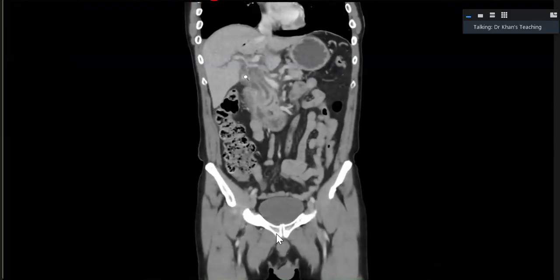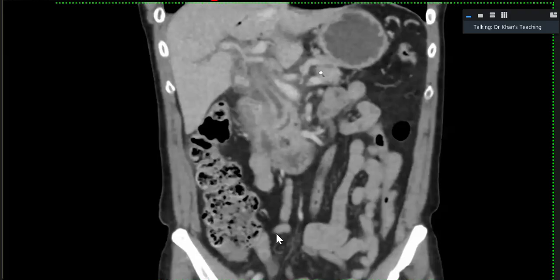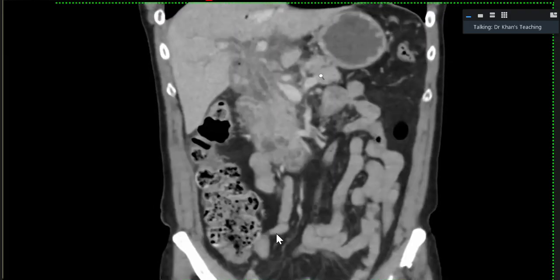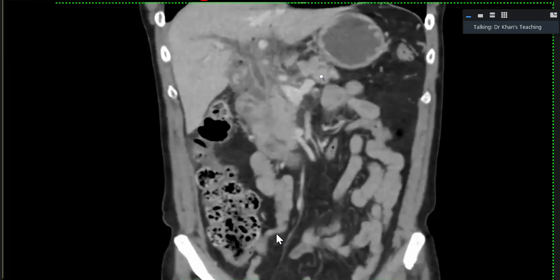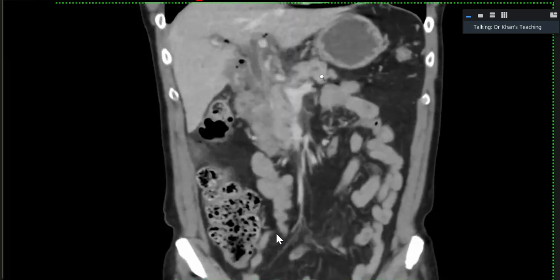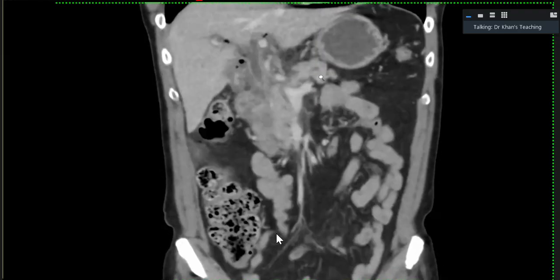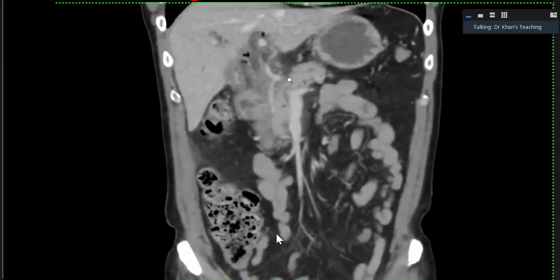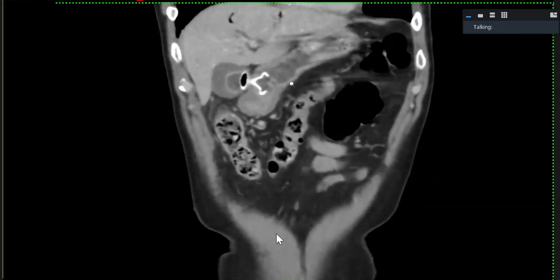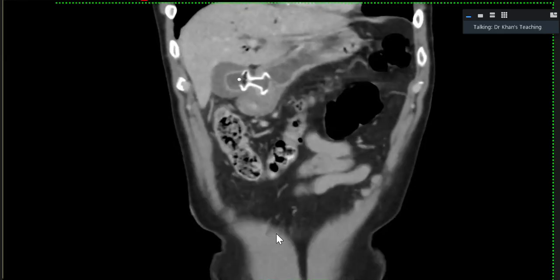the effects of that. As I've told you, nobody is stopping you to ask for a coronal. In this region, coronal is critical. Think how you report them. Describe everything. Even say that in my usual practice, I'll see it on coronal also. But coronal, just for teaching, if you see the coronal, first of all, look at the connection. Look here. This is the pyloric canal, and the stent has gone there.